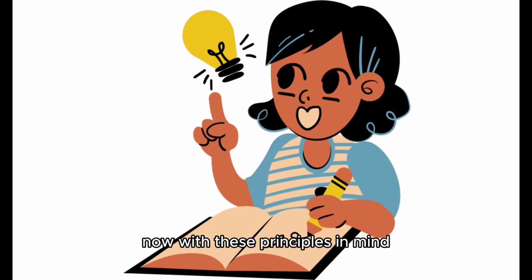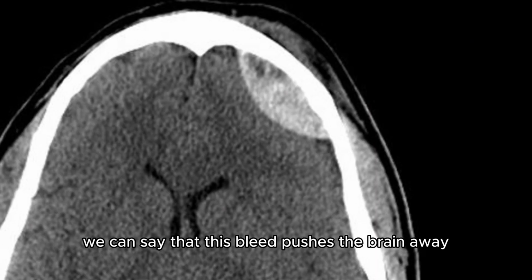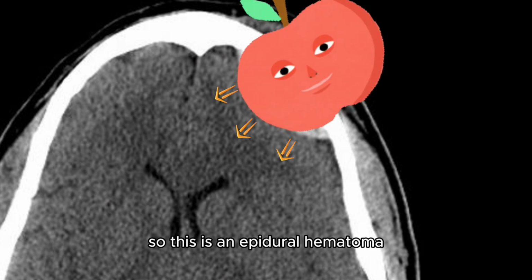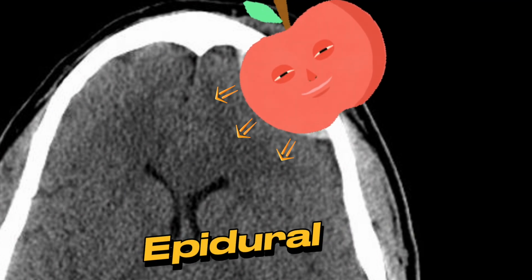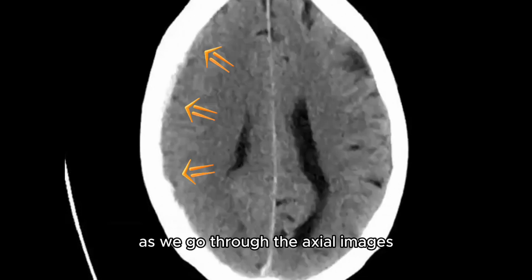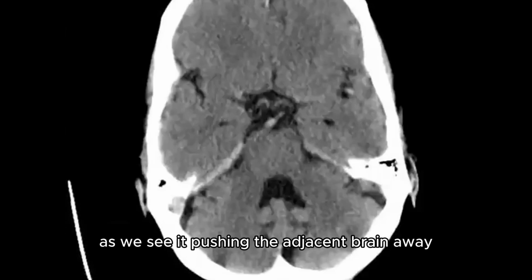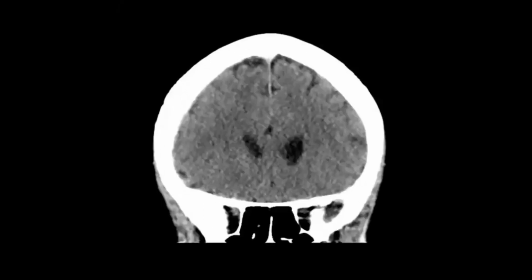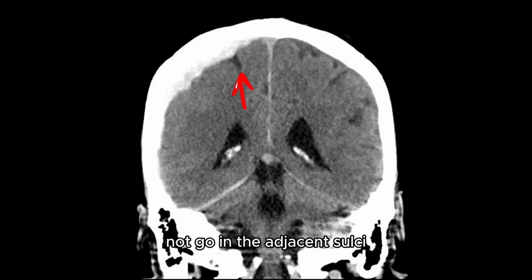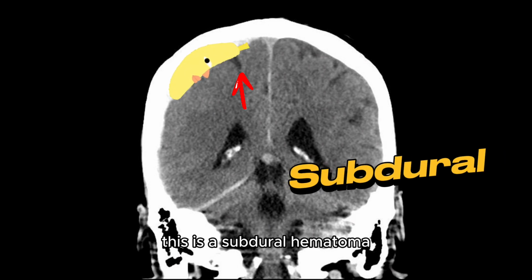Now, with these principles in mind, let's have a look at a few cases. We can say that this bleed pushes the brain away and does not cross into the sulci. The form of this bleed is quite similar to an apple, so this is an epidural hematoma. Now let's have a look at another case. Here, as we go through the axial images, we can see a bit more subtle bright bleed that is located outside the brain as we see it pushing the adjacent brain away. On the coronal, we can see that this bleed does not go in the adjacent sulci, and this form fits quite well with a banana. This is a subdural hematoma.